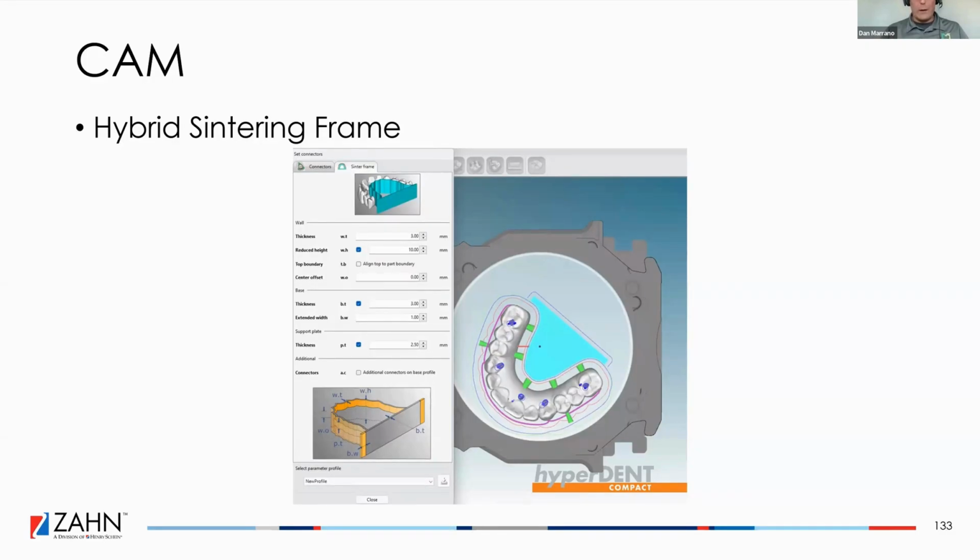Here's just real quick, I don't get carried away. Here's my settings in hyperDENT. I don't have a lot of supports on the outside because I don't want to have to overcome those supports for undercuts. It leaves a messy surface. And then the back of that support structure does actually stay connected to the zirconia. So that's what ours looks like when we mill them.